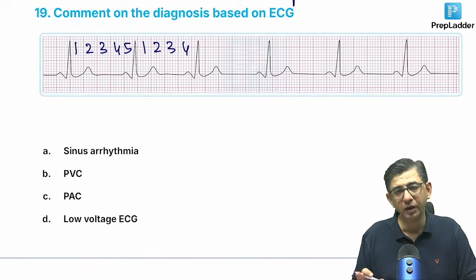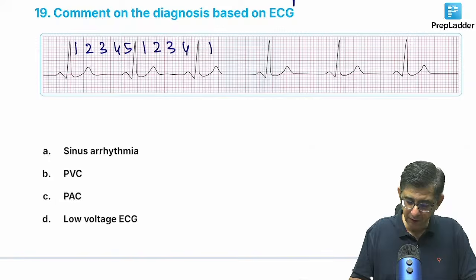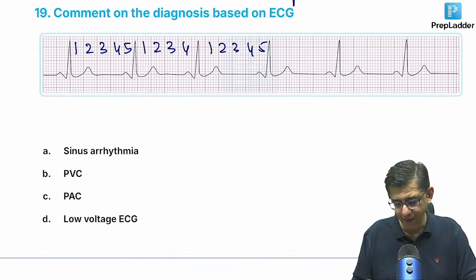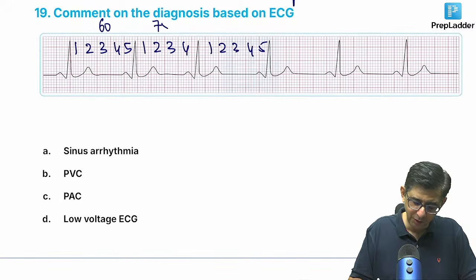पहले रेगुलरली तो हम देते ही वही है ना, like we give for atrial fibrillation we give beta blockers only. ओके जी, फाइन, I am waiting for your answers for the next one. अब तो मैं बोल बोल के परेशान हो गया। हार्ट रेट जो है नॉर्मल है, 60 है, 75 है, normal sinus rhythm present hai.